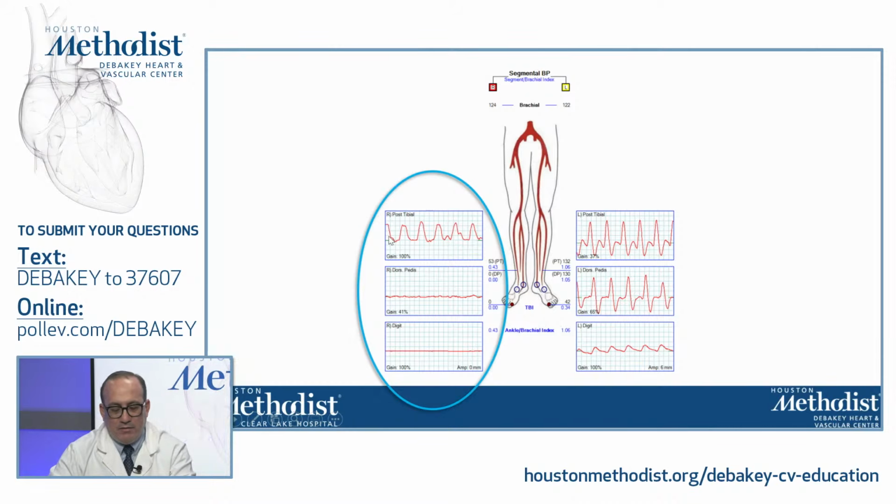Again, triphasic waveforms on the left, essentially. On the right side, there's biphasic to monophasic waveforms with a decrease in the ABI. Dorsalis pedis is occluded, and there's no toe perfusion. So this patient has significant disease on the right side. Could be tibial, could be more proximal. You know, it's not unusual to see this with a patient who's embolized, let's say, to the popliteal artery, and then they have significant compromise in flow distally. Okay.